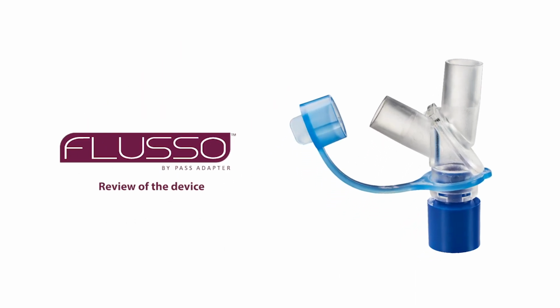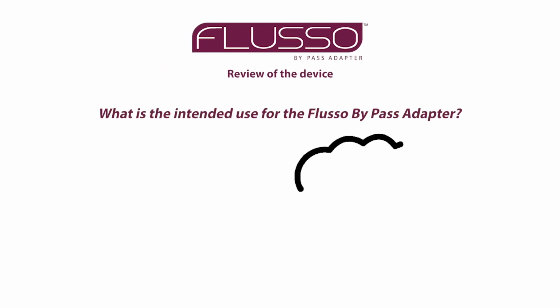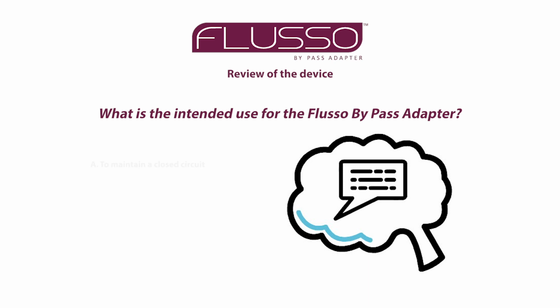Let us review the Flusso By Pass Adapter. Bypass port. Patient port. And ventilator port. What is the intended use for the Flusso By Pass Adapter? A. To maintain a closed circuit. B. Manual resuscitation. Or C. Medication delivery. The correct answer is to maintain a closed circuit.